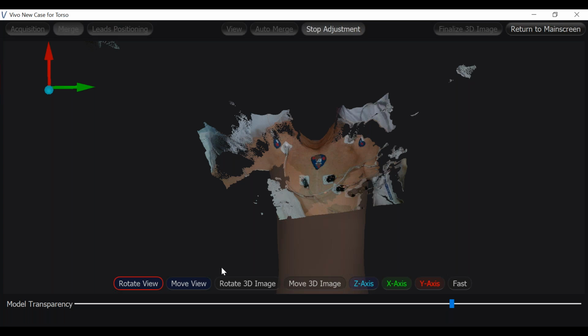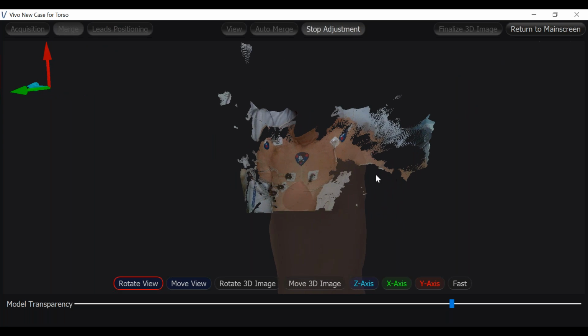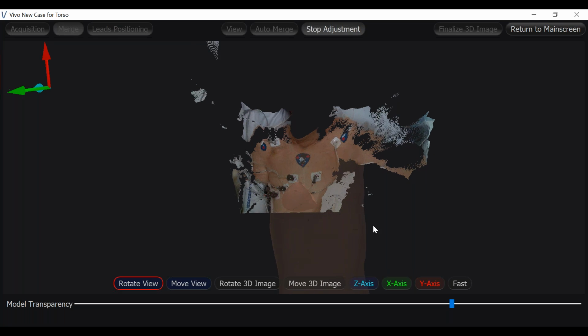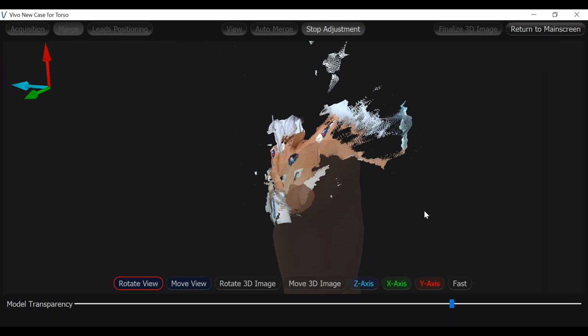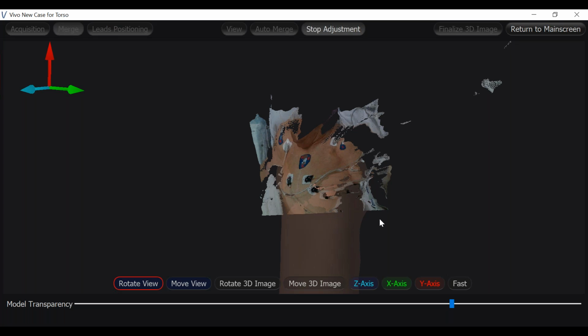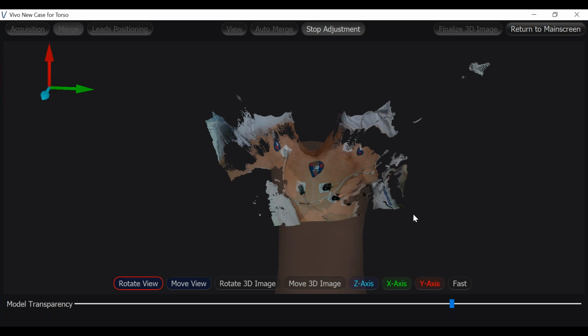And then again, like I said, I would hit rotate view so that it kind of locks that in place and turn it around. And now we see that our heart is sitting nicely below V1 and V2 with 3, 4, 5, and 6 coming around laterally. And that's what we want to see there. The shoulders of the image and the torso may not always align exactly. It's more important the electrode alignment be accurate around the ventricles.